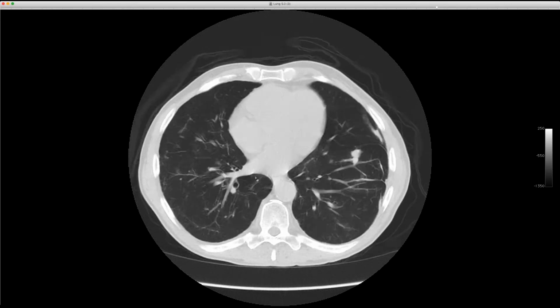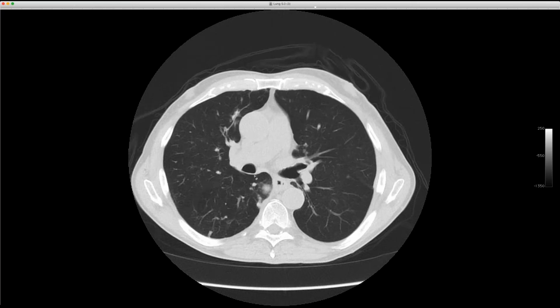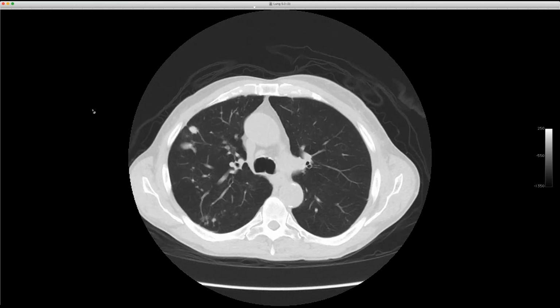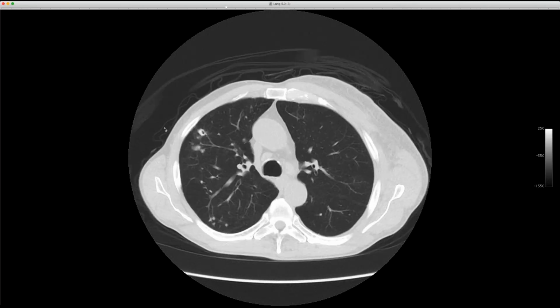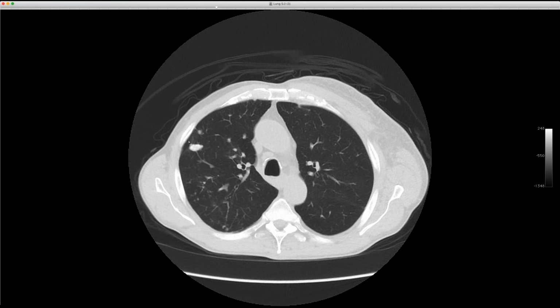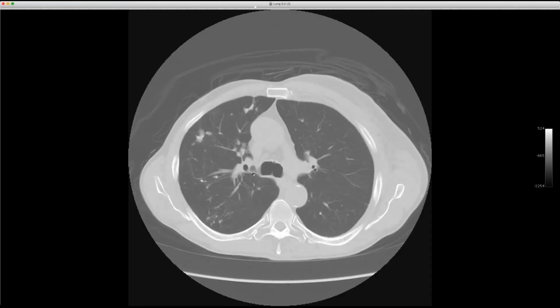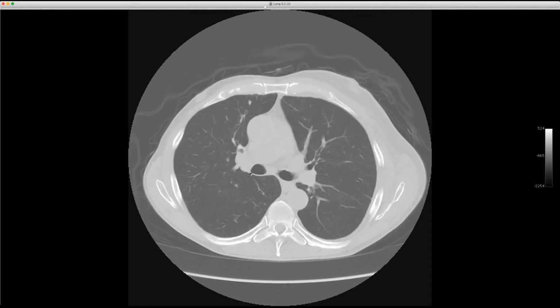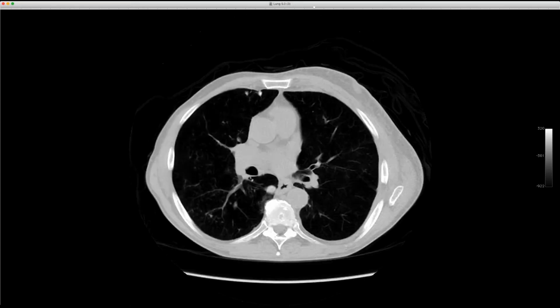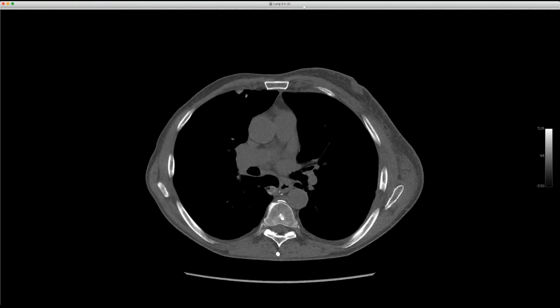So at this time, he actually had active blastomycosis. And usually when it goes away, it goes away. But these nodules persisted over several years. So here's 2017, earlier this year, and some of them even had cavitated over time. And this was developing some mineral in it. So more like what we typically see with histo, where the nodules don't always go away, they just calcify. You can see this one here as well, developed some mineral around the outside.